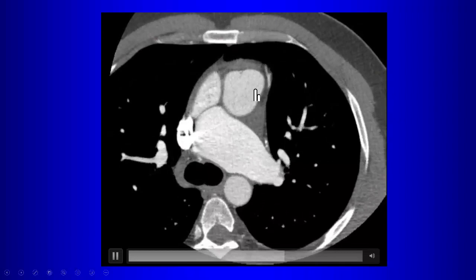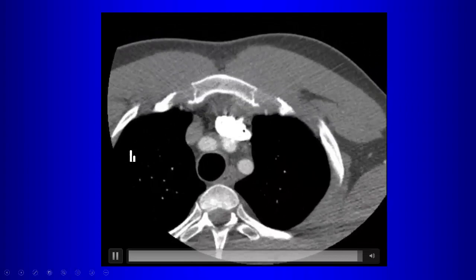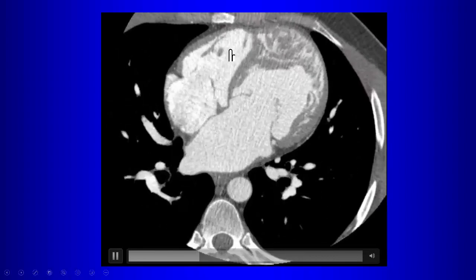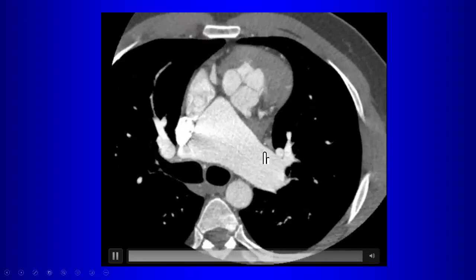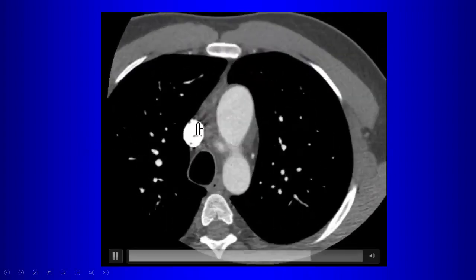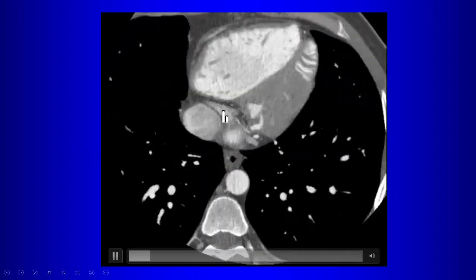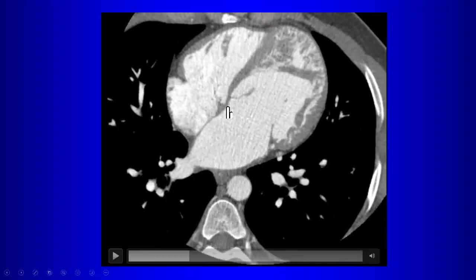Aorta. Right? And then that morphologic left ventricle, this is the morphologic left ventricle. That is connected to the pulmonary artery, right? So there's a transposition. So the morphologic right atrium here is connected to what chamber? The morphologic right atrium is connected to a morphologic left ventricle. The morphologic left atrium is connected to a morphologic right ventricle. This is atrioventricular discordance.